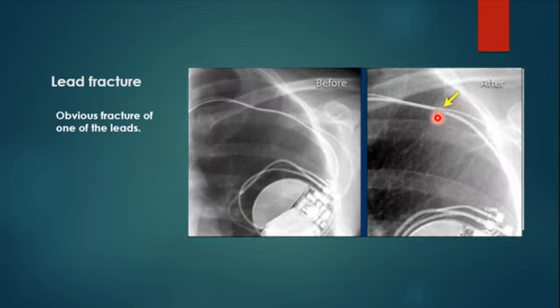Also, this is another example of lead fracture. You can see the defect here. So this is also a lead fracture.